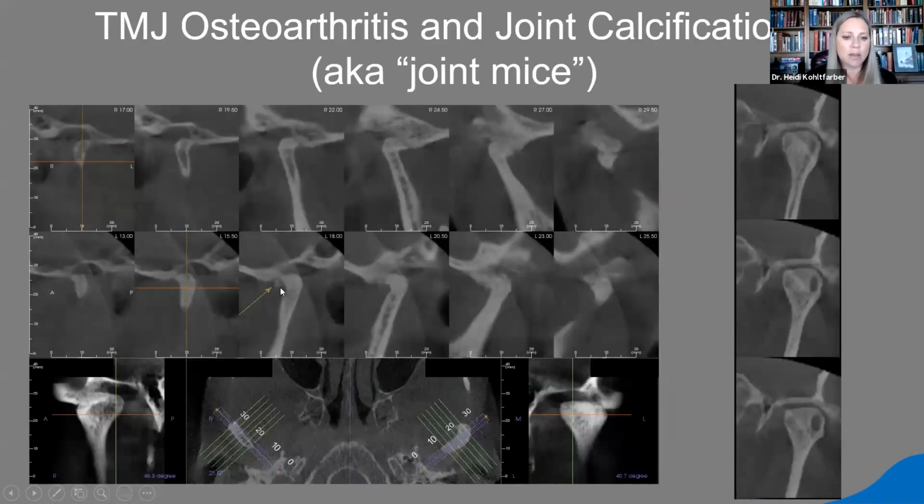We can also see that sometimes these little osteophytes will break off. So we can see osteophytes bilaterally on the right side and the left. And this is commonly how we will image it with our software. What you'll notice is that we have a nice measuring tool on the condyle, and then we've taken sections of that condyle. And there are our numbers, and of course, they're going to correlate to the numbers that we have up here. So you'll see this will tell you right 29 or left 25, so you know if you're looking at the right side or the left side. And then, of course, we typically have a coronal section as well. Now, we can flip these, and we can do coronal sections with these also.